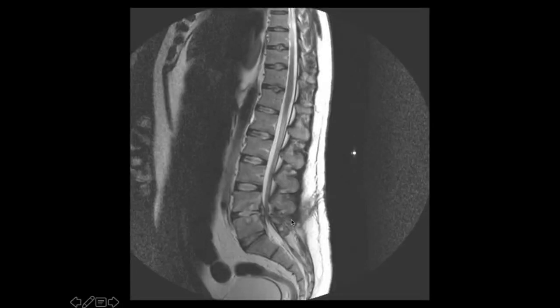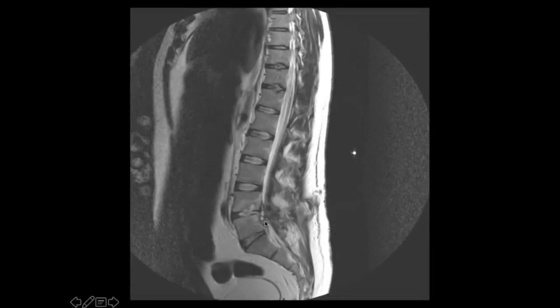So the patient had a prior discectomy, microdiscectomy at that level. We see that the vertebral end plate is destroyed over there, and with the eye of faith, you can see that there is sort of a focal fluid collection within the sort of intraosseous abscess which is forming. Go slightly further and you start seeing this epidural focal fluid collection. So there's an epidural abscess as well, which is causing impingement or compression of the cauda equina. So there was a cauda equina compression which was secondary to a spondylodiscitis with an associated epidural abscess.